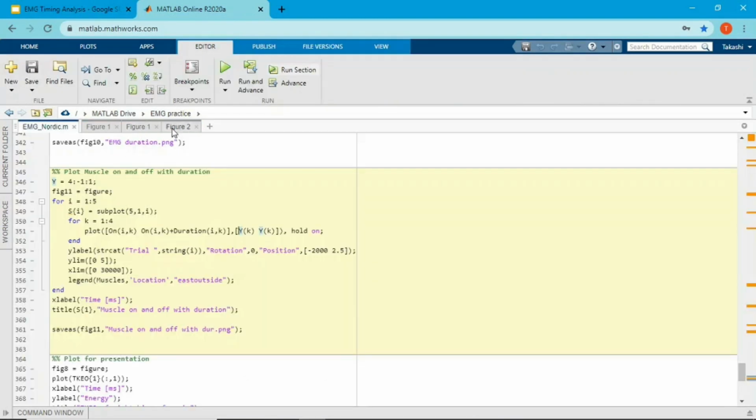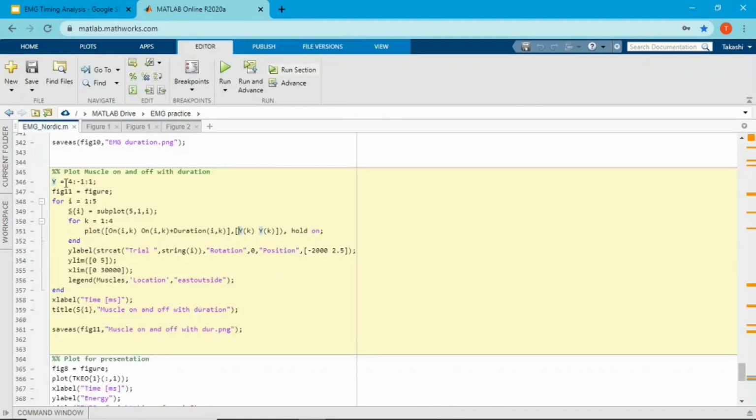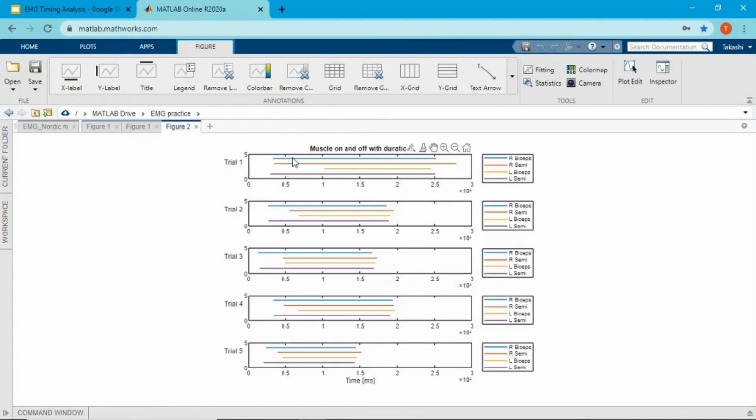And the legend recognizes the first loop is on the top of the legend right here. So it doesn't really matter because color doesn't change, but for just better looking, blue is always top, red is always second, yellow is always third. That's why I just define the y from 4 to 1. So the line actually goes from top to bottom. Then it's aligned with the legend.